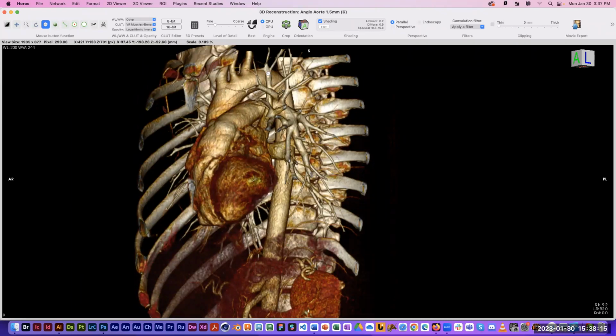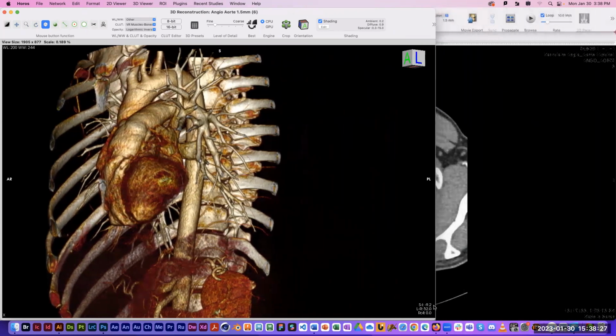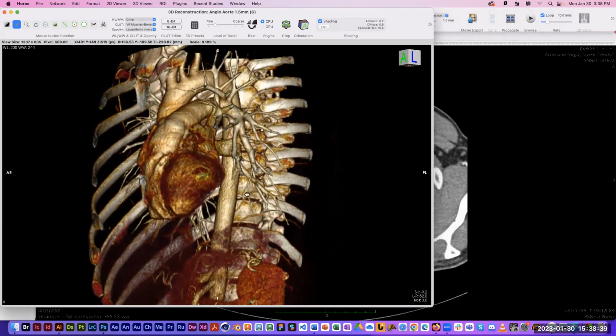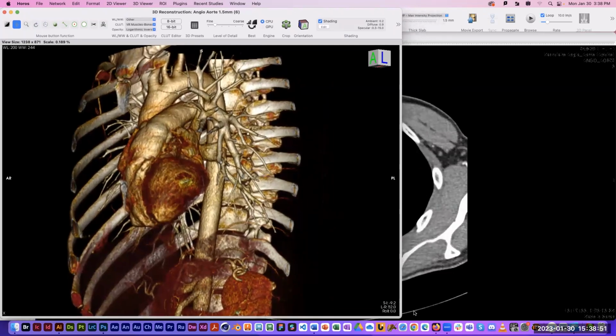So I think this is going to be pretty good. I'm actually going to resize my window. Just drag the bottom right corner and drag this over. Maybe reposition, recenter the body. The only advantage to that is that you're not going to end up with all that excess black space around the body. So there we go. That crops off a little bit of the excess black space around the body. It doesn't really matter if this little cube shows up, but you can actually hide that cube just by clicking the orientation box here. And that hides that cube, as well as hiding some of the other text, which we're not going to include in our Photoshop image anyway, so it doesn't really matter.